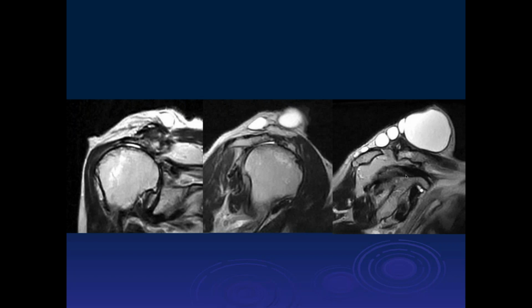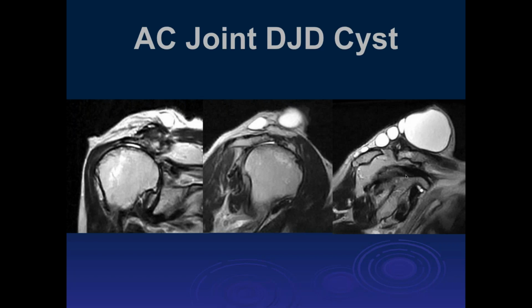Yeah, so these would be consistent with the geyser lesions of the acromioclavicular joint. Some people call these the geyser sign. It's just a cyst that emanates from degenerative disease of the acromioclavicular joint.